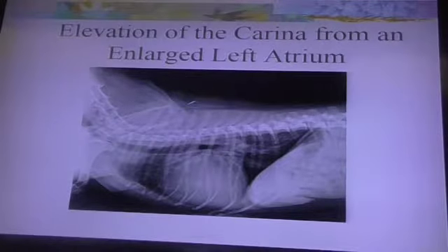You're going to say interstitial, you either have to say moderate or severe. If you're going to say alveolar, moderate. Alveolar, you can say mild, moderate, or severe, because anytime you see an alveolar pattern, that's going to be abnormal. But a mild interstitial, you're on the fence. Everybody got that? Now you can use it, but it doesn't really mean anything, so you're on the fence.